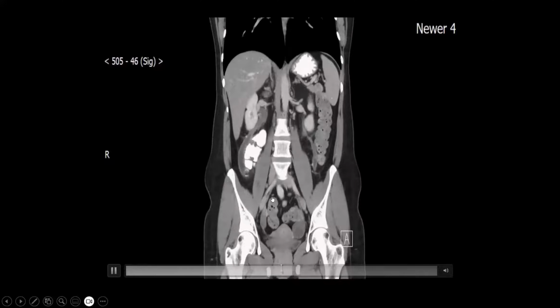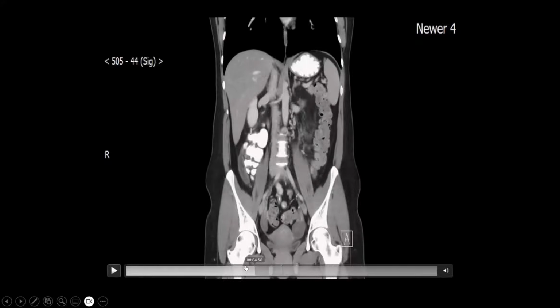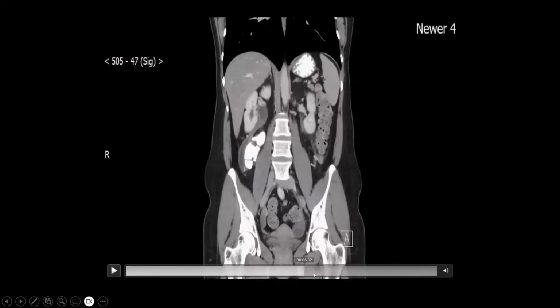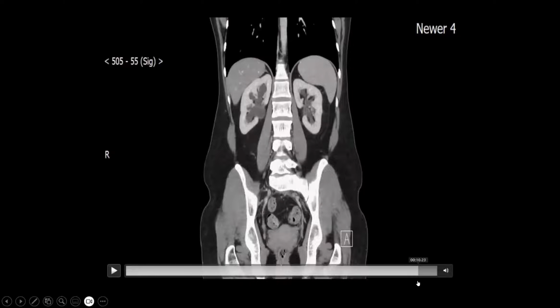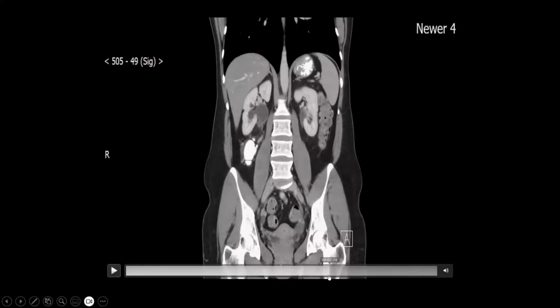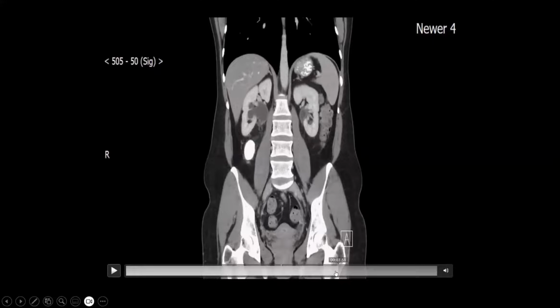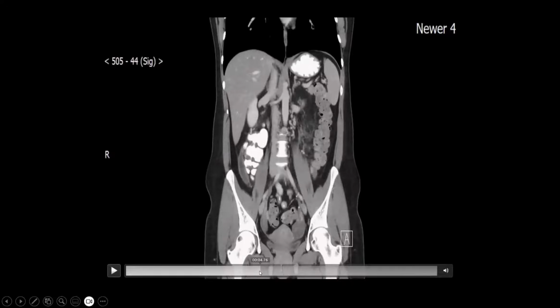Okay. So let me give you another hint. This was not congenital. This was surgically done. Like the course of ureter was altered surgically. So basically, there was some process going on in the retroperitoneum, and that's why there's something in the left side that looks bad too. So both sides were like they're both laterally displaced.